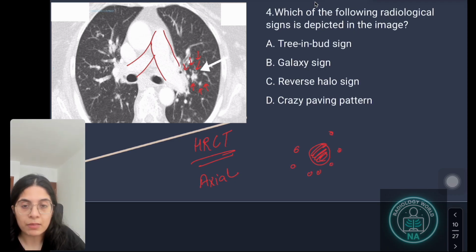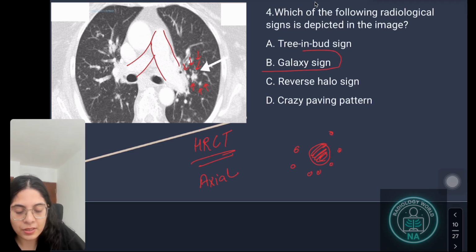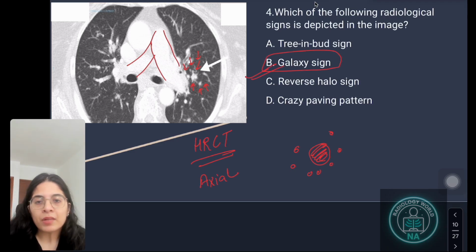So what is this representing? This looks like a galaxy of stars. Okay, so the answer over here is the galaxy sign. If you do not know this sign, just look at the other options also. Maybe by ruling out the options, you can reach the most correct answer.